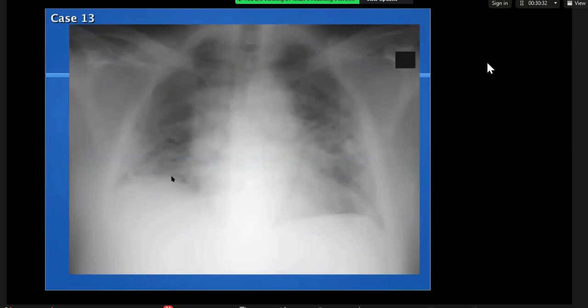Okay, so this is a frontal X-ray. There is volume loss in both lungs with increased reticular shadowing involving the peripheries. The heart borders are shaggy. There's a midline sternotomy. Overall appearances are of an underlying interstitial lung disease with fibrosis.